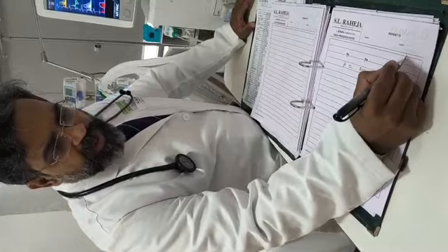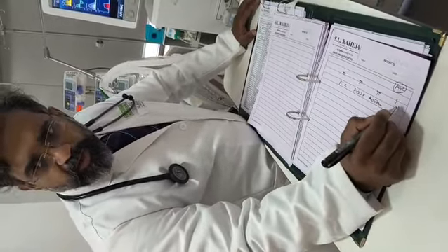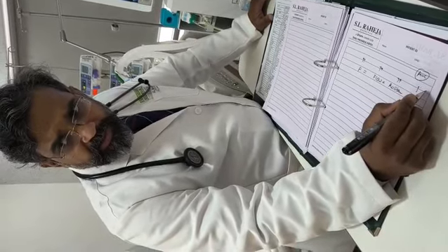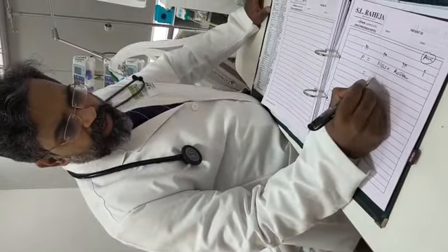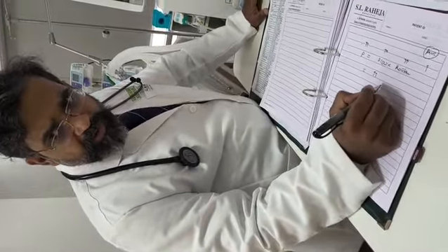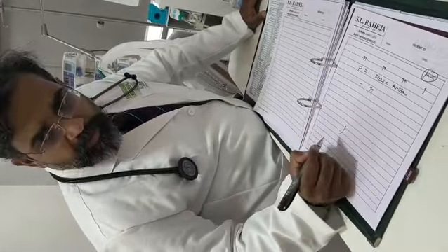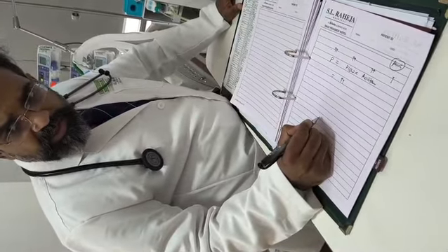Now since we have put PRVC mode, what is going to happen is the flow initially will be very high, because it has to reach that particular volume as well as the pressure that we have set. That's why PRVC. Initially the flow is high, so you have it rising up, but as the entire flow rises up, the resistance of the airway also rises along with it. That's why the pressure is rising.